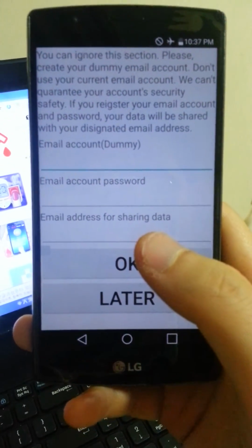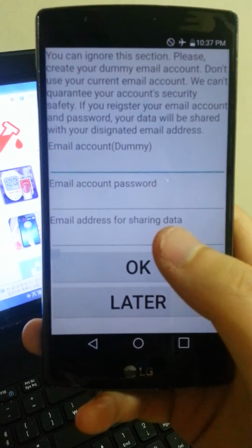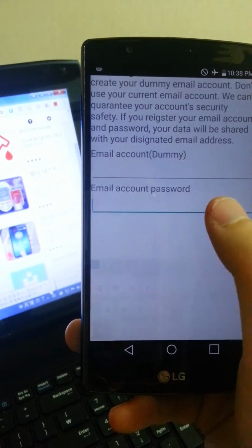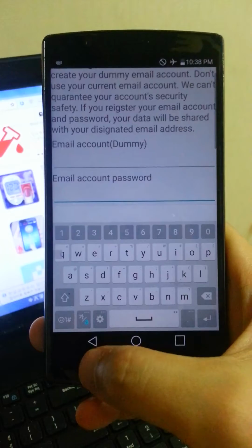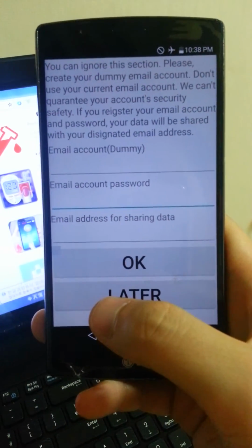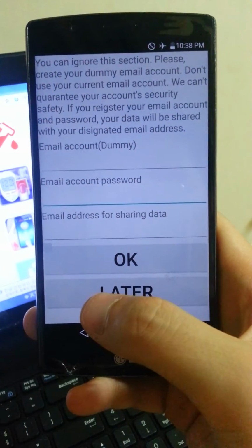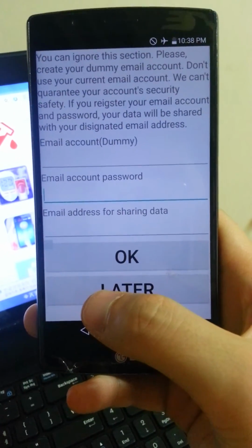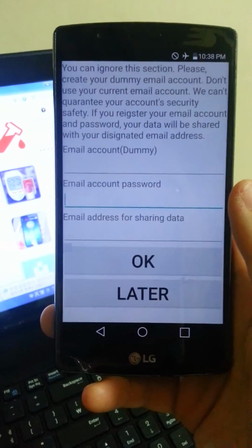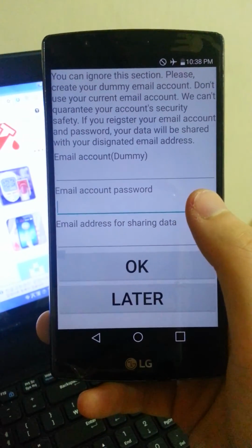You can create your email newly easily and use that account because you have to register your email password. For your reference, your data is not leaked. In other words, your data is not shared by other persons who you may not know. Nevertheless, I recommend to use a newly created email account.